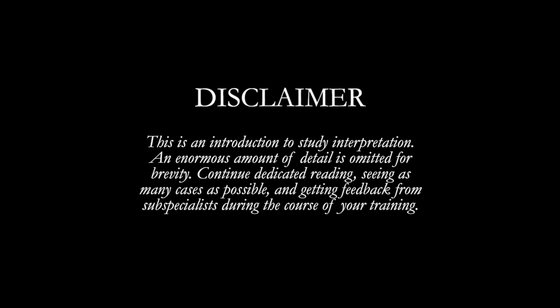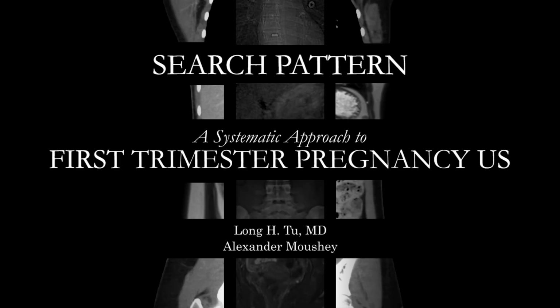Please note that this is an introduction to study interpretation. An enormous amount of detail is omitted for brevity. Continue dedicated reading, seeing as many cases as possible, and keep getting feedback from subspecialists during the course of your training. All right, today we're going to talk about a basic approach to the ultrasound of the first trimester pregnancy.